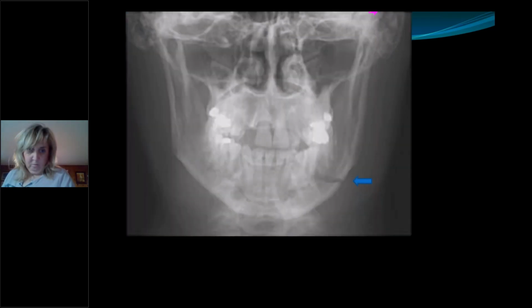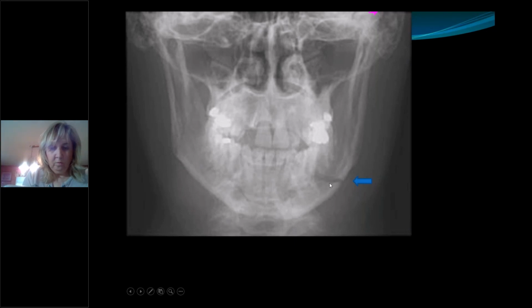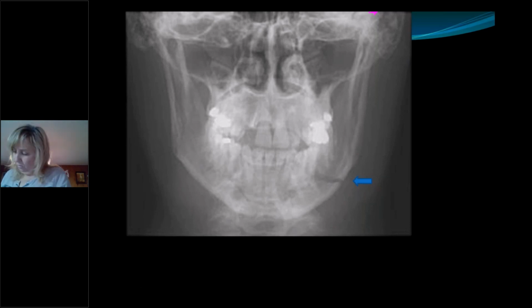It's a mandible fracture. Typically, like I talked about ring fractures, when mandibles fracture, they tend to fracture down by the mentum, and then they usually will break up high. You don't really care because at the end of the day, if it's broken, it's broken, and usually maxillofacial will take care of that. Sometimes plastics is the other group that will usually take care of that, depending on your facilities and how rural or urban you are.